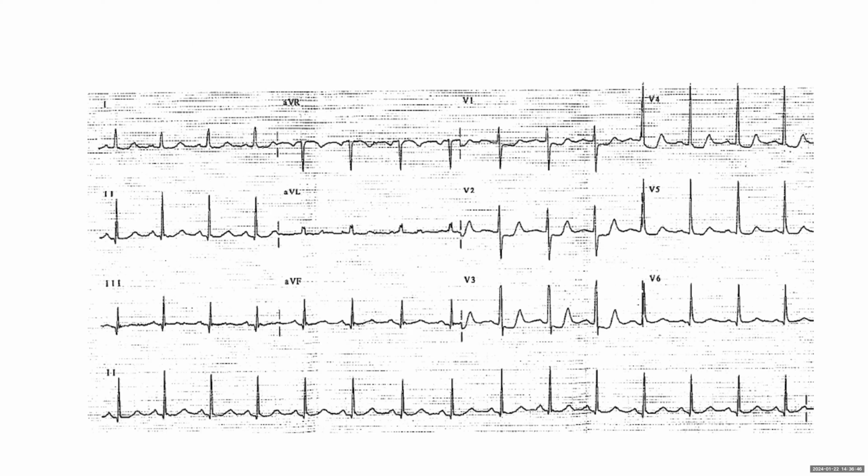The other things you guys mentioned, so prolonged QT, again, it's hard to measure QT here. Probably not prolonged, but for the exam, it might be fair to add. LVH, I think, is a fair one. Probably fulfills voltage criteria for LVH, so that's a good one.